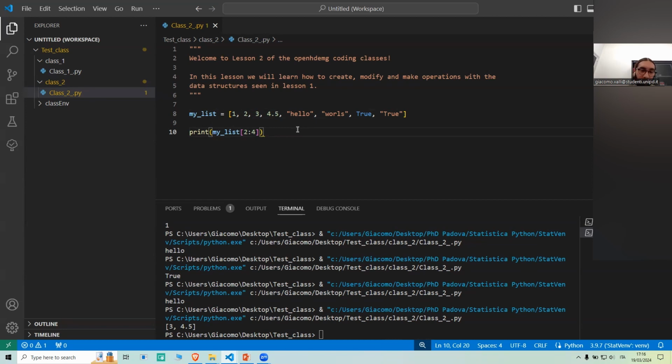This is complex at first, especially if you are working with MATLAB, this is an enormous difference. This will cause most of your errors when you write the code. But once you get used to it, you understand that this is fundamental for the correct functioning of Python, because being in base 0, if you know that your list has 10 elements, and you write 10 instead of 9 to access the 10th element, you will get an error because your 10th element will be the 9th index, okay?